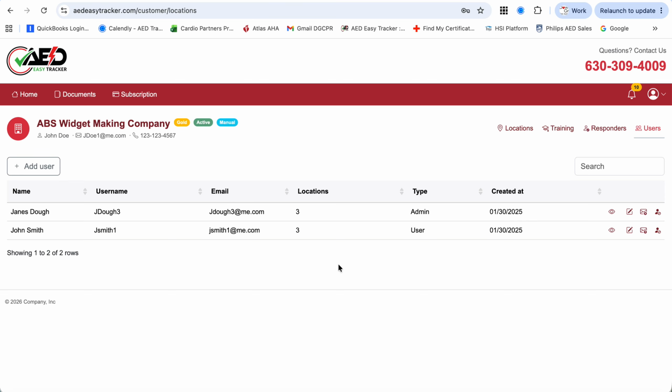Not necessarily a bad thing, but if you are wanting to have full control over what is going on with adding users, you, the owner of this program, should be adding users from this screen as opposed to within the actual location.